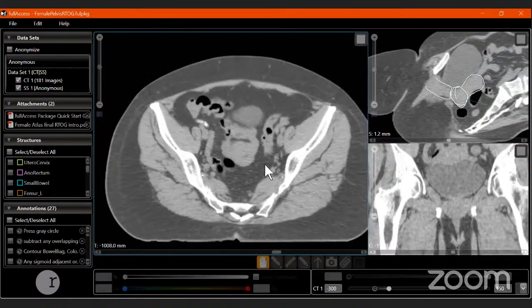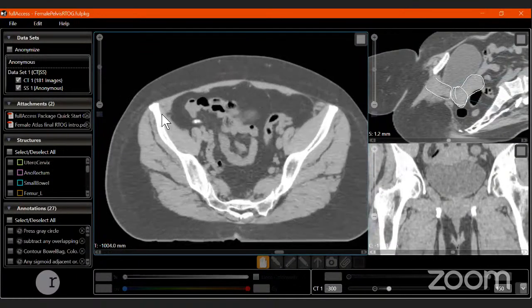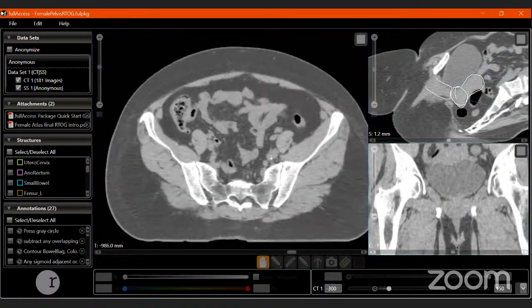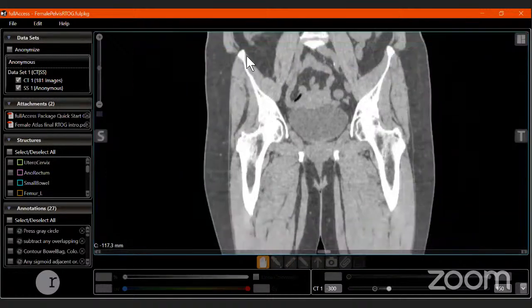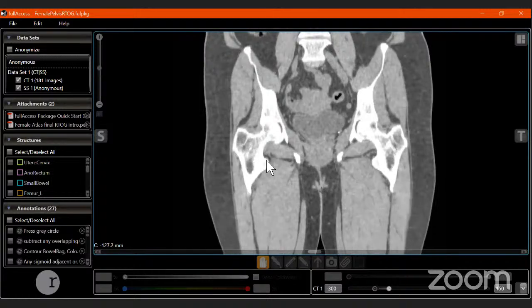So the image starts for the inguinal contouring. We always start, as I said, with a horizontal component extending from the anterior superior iliac spine onto the pubic tubercle, and a vertical component extending from the origin of the femoral artery downwards. The question is about the inferior border. The inferior border is the lesser trochanter.